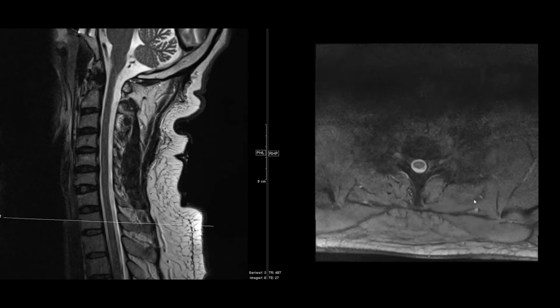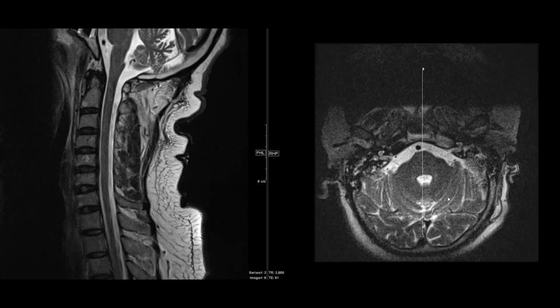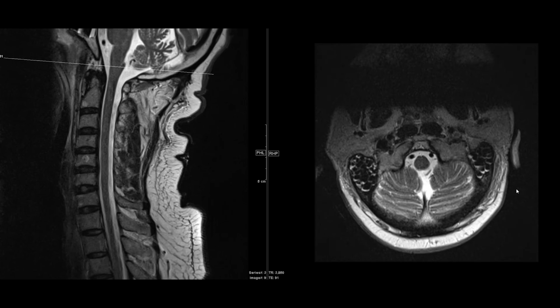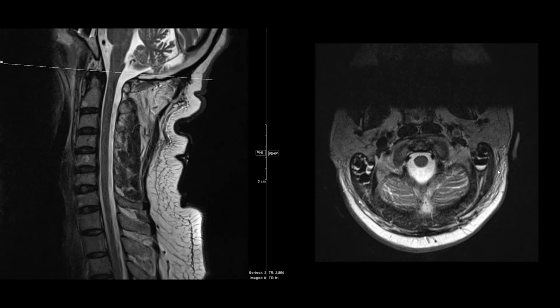The other thing that's not normal in this case is you'll see a tube. This looks like an enteric tube here that's coming in through the nose and actually going down here, so you kind of catch that. You see that, so you want to keep an eye on things like that. Then come to your axials and take a look through your axials. Again, you'll see a few things that are abnormal here in this intubated patient. You see some fluid in the mastoids, so those mastoids are too bright. Got some fluid abnormality there, which can be typical in an intubated patient.